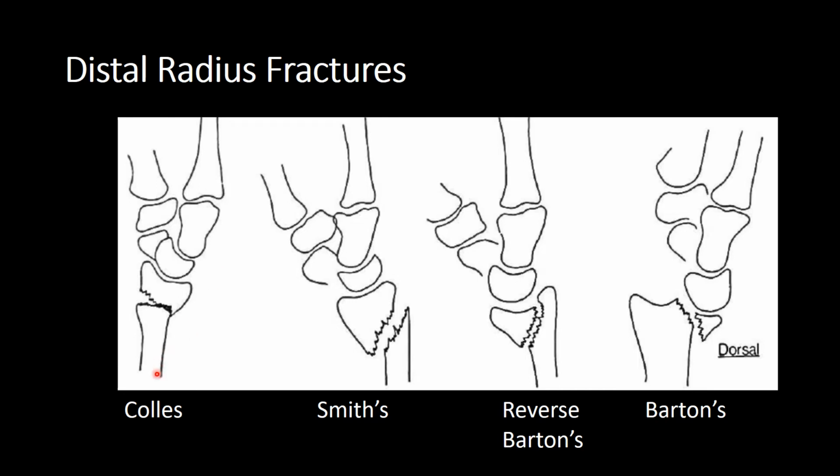And this dinner fork deformity is really quite classic, and I'm sure a lot of you have seen clinical indications with just literally writing dinner fork deformity, and so already they're thinking there's a Colles fracture, or almost certainly there is a Colles fracture because of this abnormal shape to the bones.